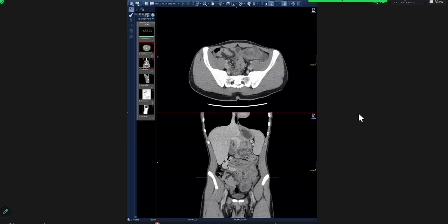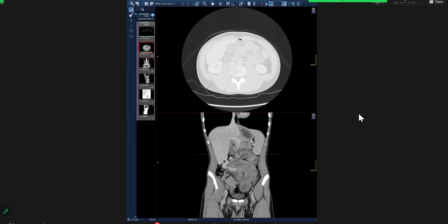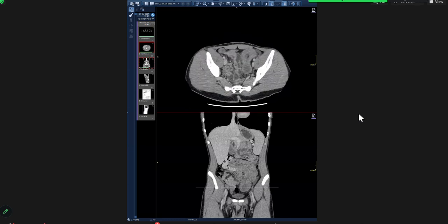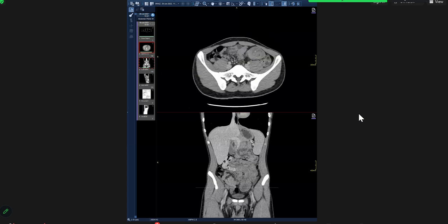An important thing on any abdominal CT is that in your routine practice, you want the lung window for any perforation. Don't miss it on any abdominal CT you're looking at, especially if there's an obstruction. Always talk about the lung window to identify that there's no perforation. And the second thing is the vessels. Always try to look at the vessels. So these were the two important things in this one. Okay, very good. So we'll go to your last case now.